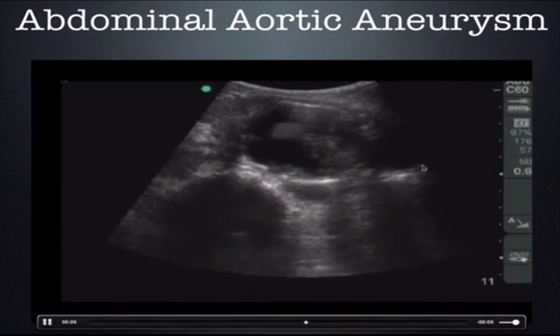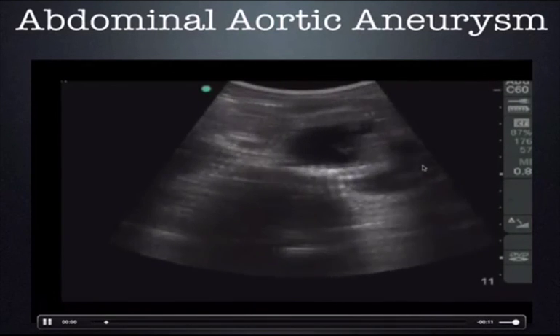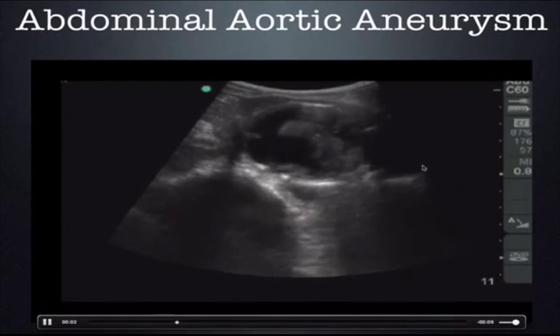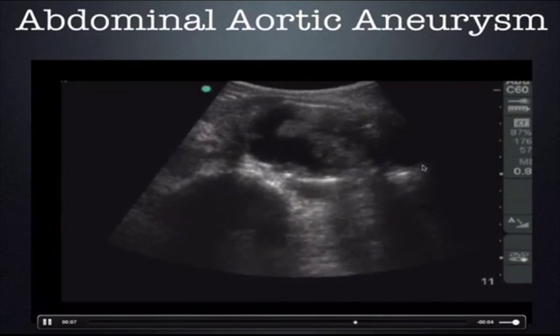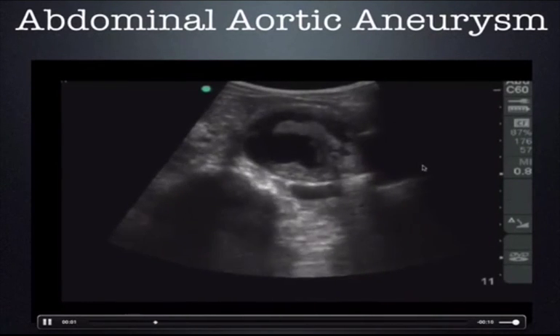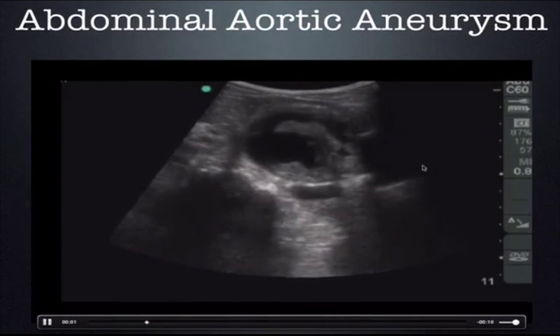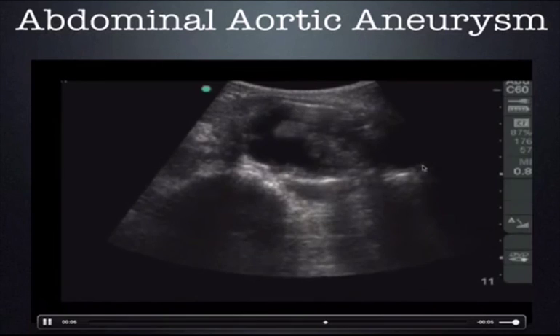As we've discussed in other lectures, ultrasound is not a reliable tool to identify free fluid in the retroperitoneal space. So if you see this, in all likelihood it has ruptured, but I would not expect to be able to see free fluid outside of an aortic aneurysm every time that it is ruptured. That's more of a clinical diagnosis. If the patient is toxic in appearance, hypotensive, has syncopized, or has flank pain or abdominal pain, you assume that this is a ruptured AAA, whether you see fluid outside the aorta or not.